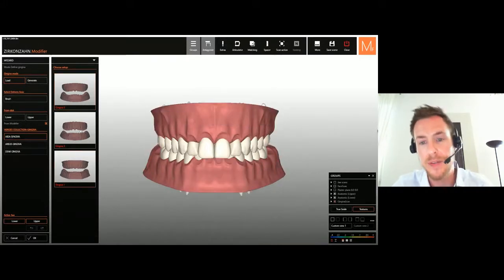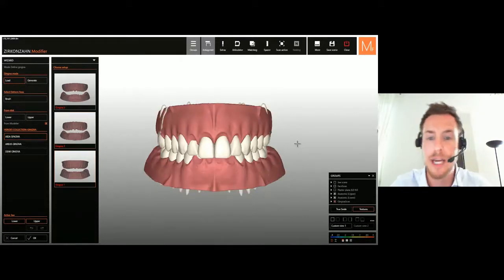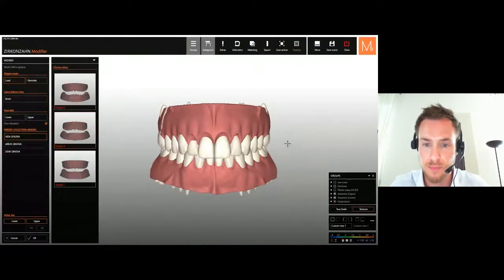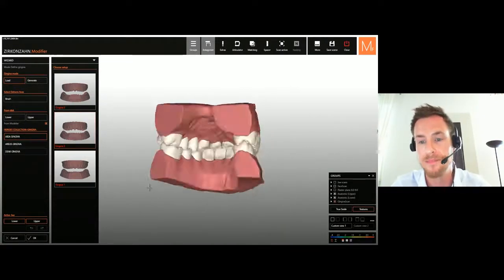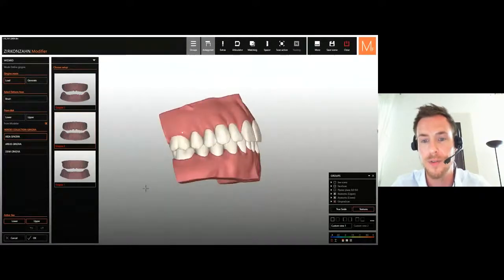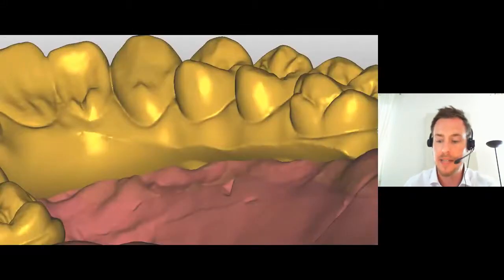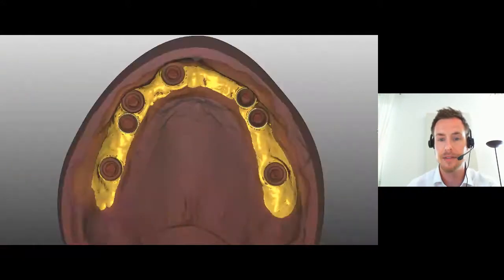Till now we have 3 different shapes. Not only the outer surface is nicely shaped with a nice texture, also the inside with a palate or the lingual part as well. So in other words, I'm able to create gingiva with just one click. Look at that, isn't it beautiful? So that I can save out, and I can adapt on implants, for example, like in this case, just adapt it, make the basal area nice round shaped, and so on.